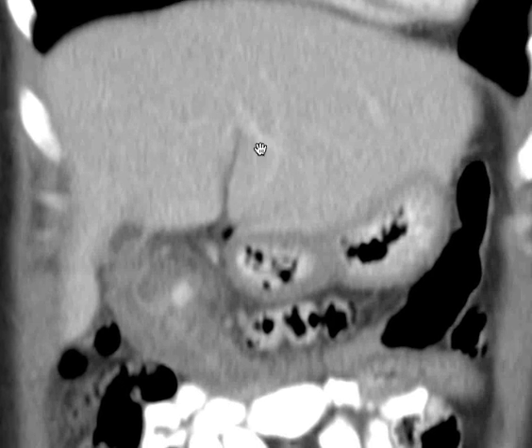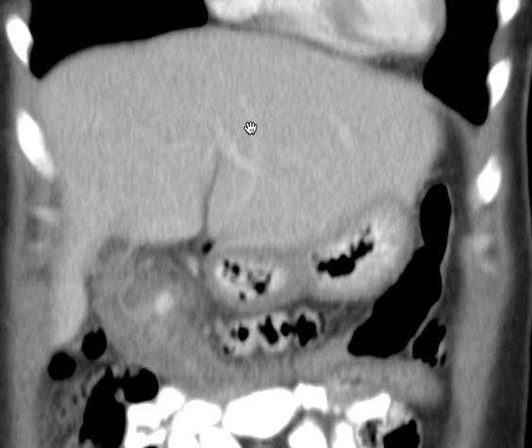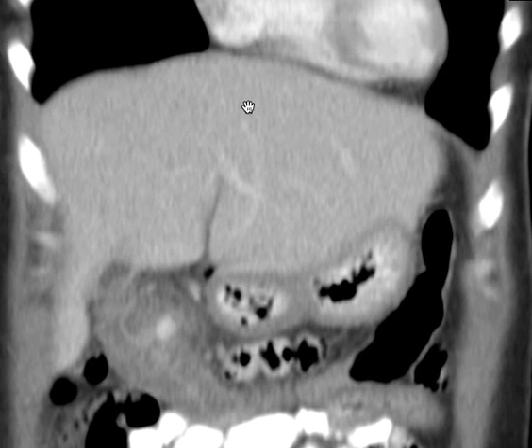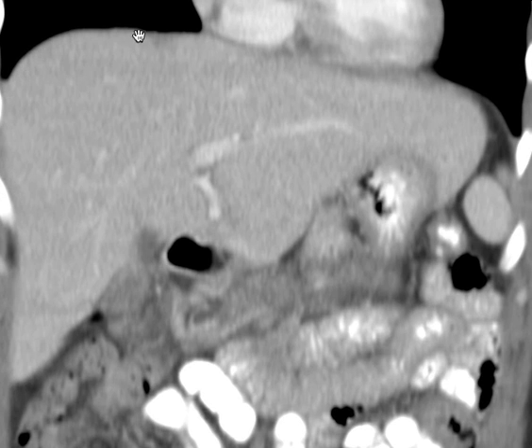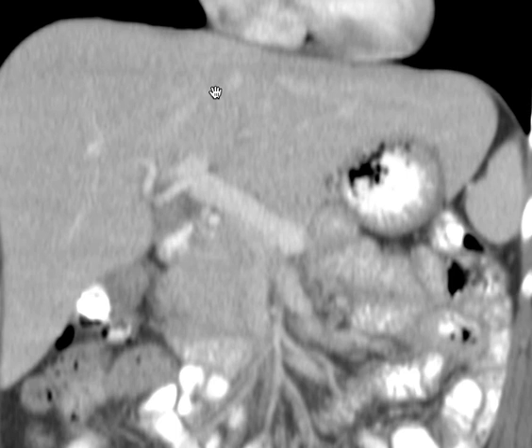Okay, and other little incidentals here. This liver really looks big, especially disproportionate enlargement. This is all left lobe, and then this would be right lobe right here. So the left lobe is bigger than the right lobe, or at least as big. And that's what happens in cirrhosis. The liver overall gets small, and sometimes the left lobe gets enlarged. Certainly it becomes enlarged relative to the right lobe in many cases.